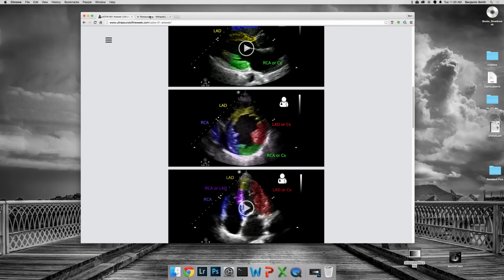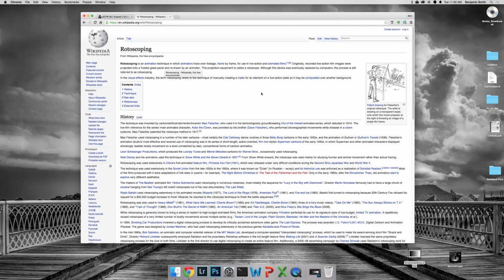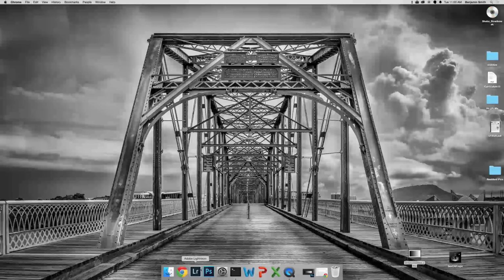Some people have even asked me if I've been doing rotoscoping. That's where an animator goes through and frame by frame colorizes every single shot. At 30 frames per second for a 6-second clip, that would be a lot of time for me. So it is not rotoscoping. It is, of course, everyone that knows me knows that this is going to be a Photoshop technique.